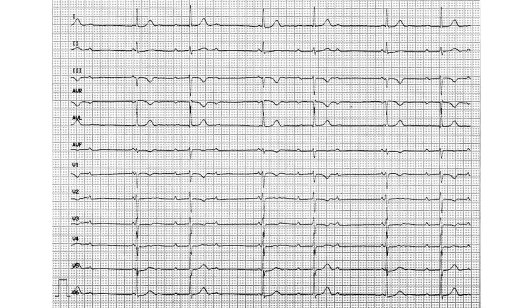Point 4, you describe the P waves. Point 5, PQ interval: you see there's one thing over here, and it's totally different over here. So you mention that the PQ interval is changing, is not constant. As a pathology, you mark it.